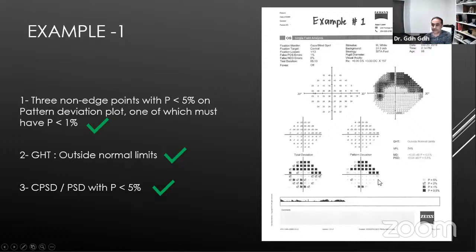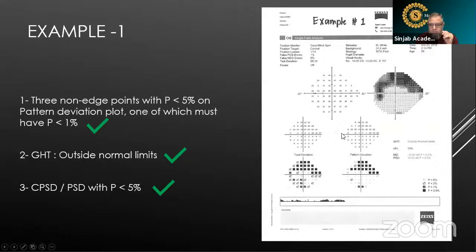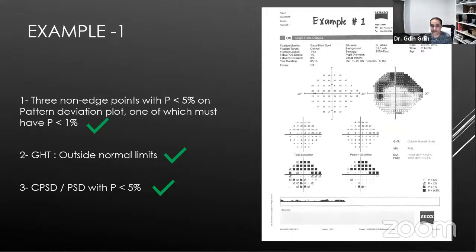What type of pattern is it? I mean, just name it. Give it a name. How does it look? Arcuate? Yes, arcuate. It's a superior arcuate. And in a superior arcuate, we expect to see an inferior notch in the optic nerve head. So in this patient, they have either an inferior notch in the optic nerve or inferior pit, and it's reflecting. Everything is opposite in visual field. Whatever you have in the temporal thinning or notch will show you a nasal step. Inferior notch will show you a superior arcuate. Superior notch will show you an inferior arcuate on visual field. Everything is opposite.